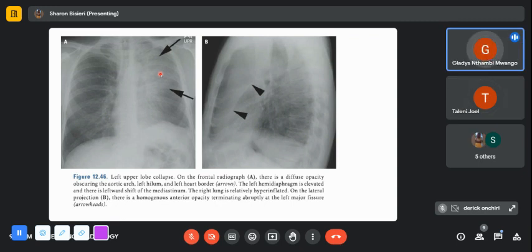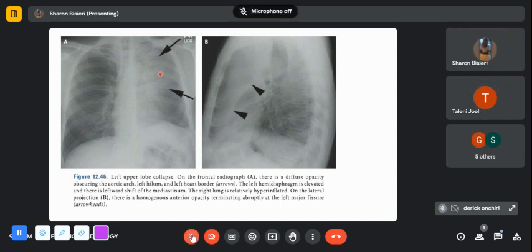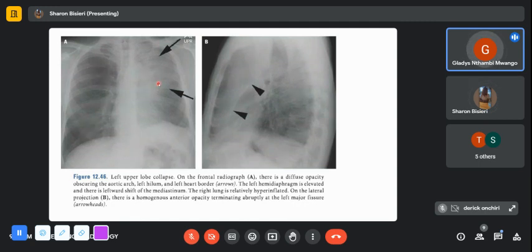Yeah. So do you remember the sign? It's a German word. Merkel's? No. It starts with an L. Luftsichel. That's the sign, right? What other sign do you see? All the signs actually here. And I thought we didn't do collapsed lung with you guys?